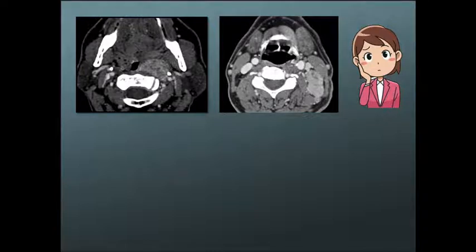And this one was actually not in the carotid space. This is in the retropharyngeal space, retropharyngeal lymphadenopathy displacing the carotid laterally.